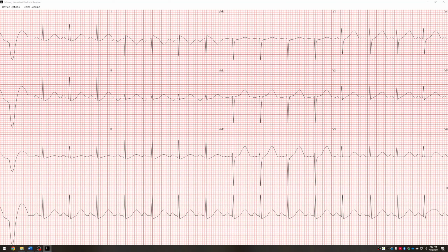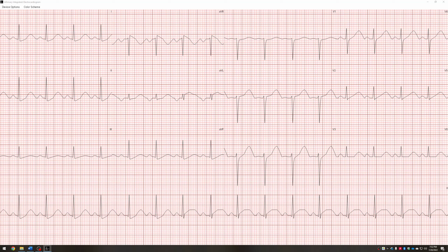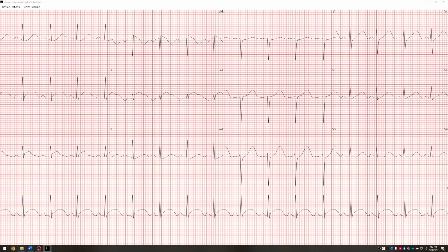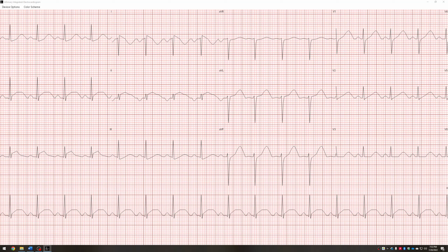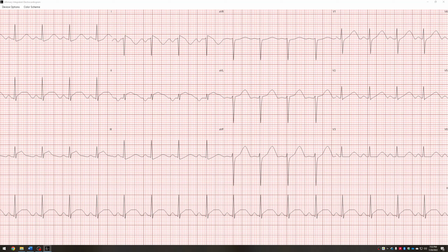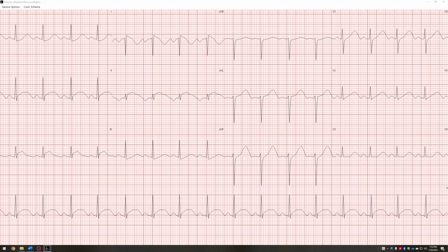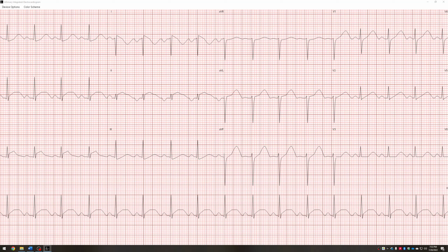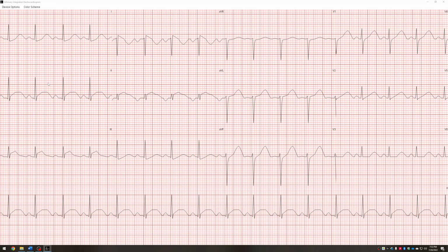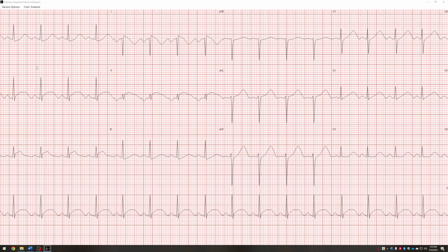So you can see that changing rhythms, first off, is very smooth and natural. Changes to the patient model, the underlying digital simulated patient model, happen according to the cardiac cycle. So when you change a patient's cardiac rhythm, it does change on the next heartbeat. Of course, if there is no cardiac cycle or if the cardiac cycle is extremely slow, I do have a backup timer that kicks those changes in after about 5 to 10 seconds. But otherwise, cardiac modeling is relatively natural when it comes to using the cardiac cycle and modeling that appropriately.